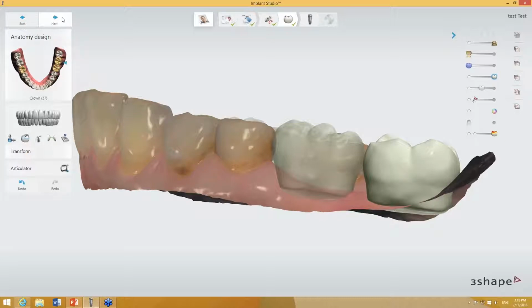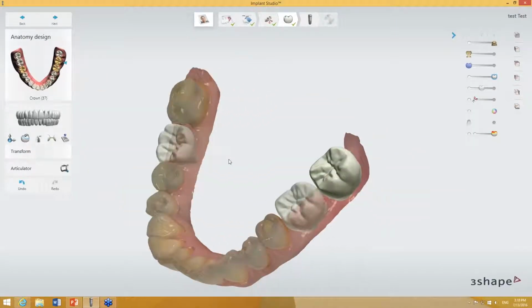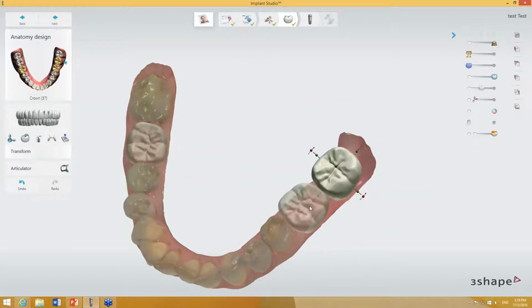So I would say that for basic placement, basic tools, and the small hint how to initially place the model, that will be absolutely enough. And yes, you can carry on not worrying about anything else. Of course, if the initial placement of the anatomy is different, then it just takes a little bit more time to get it to the right position.